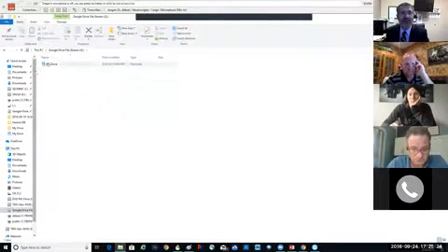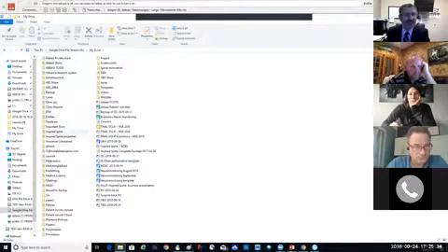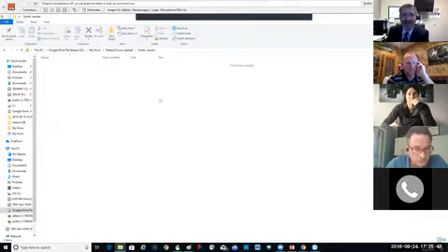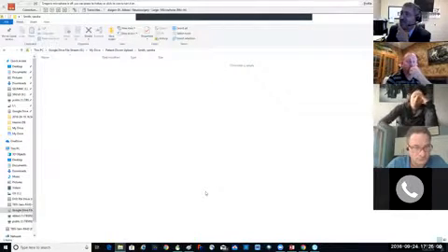Let's see here. I go to my drive, and you remember, what did I call it? I called it patient DICOM upload. Do you see that there? I did it online, but now it's like a local drive. So here, Smith, Sandra, and if a patient uploads that here, then it's already there on my local drive that I can share with people. I can upload to the XIView and so on.